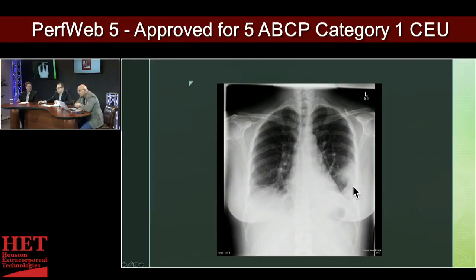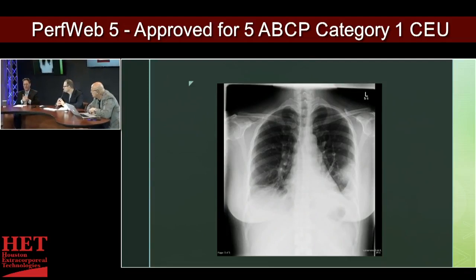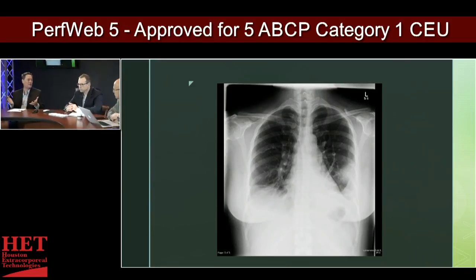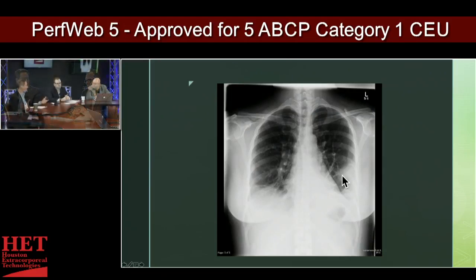I want to ask a very basic question about X-ray, and I'm asking a very simple question, but I've always kind of wondered. X-ray is going to pick up the density of what it's seeing. So when we see a patient who's got really bad lung problems, we see more white. So in this case, I see a little bit more white down in the left lower lobe. Yep, right there. So there's more density, meaning that's disease or that's congestion, fluid or something?